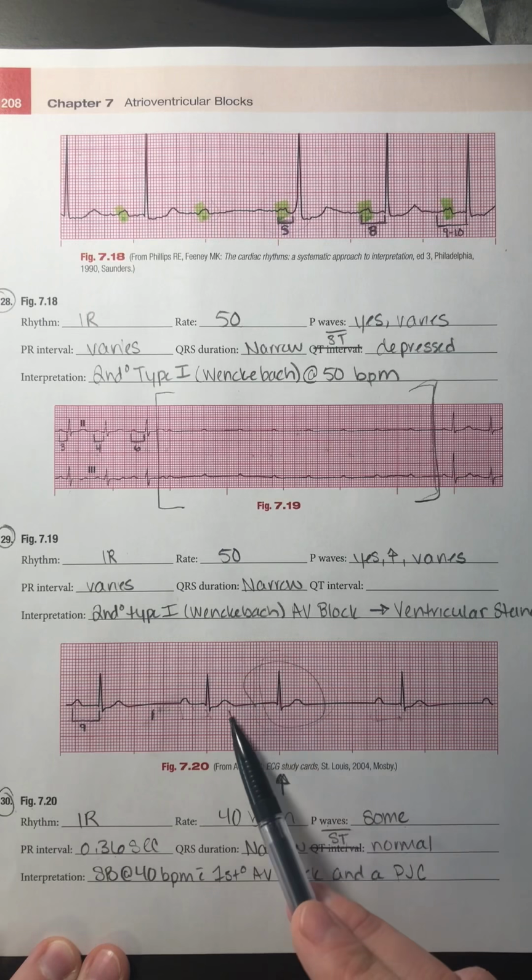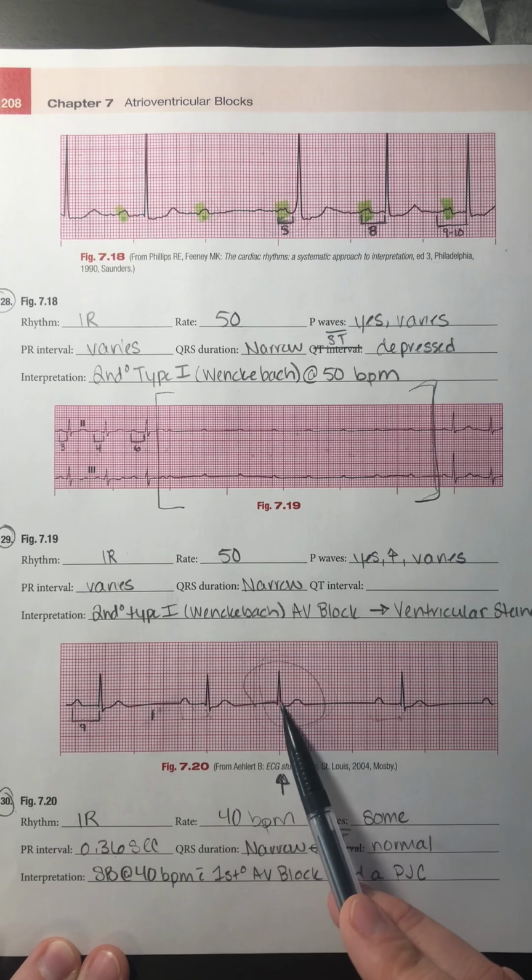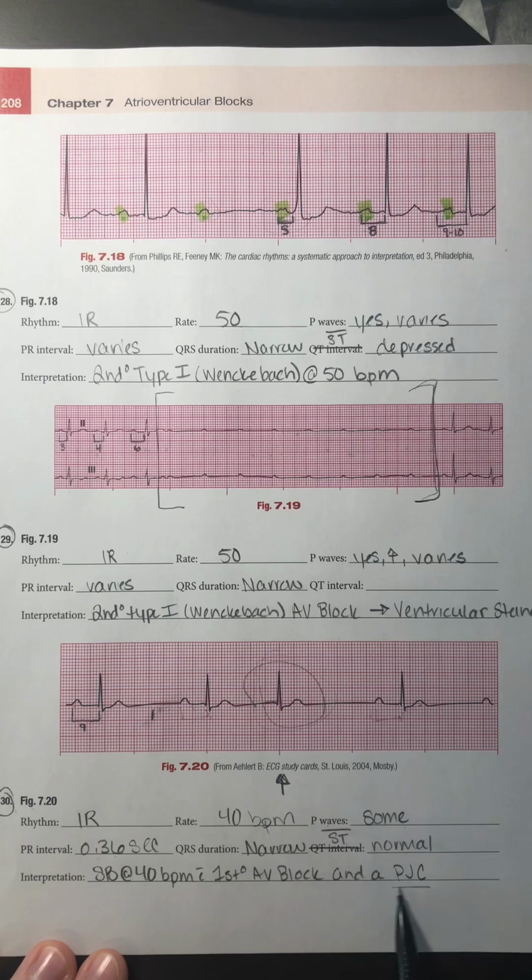And what we have going on here is this beat does seem to come early. It has no P wave, so that's actually a PJC, premature junctional complex. So thinking back to our junctional rhythms, because of that lack of P wave. And what's happening here is probably that this rhythm is so slow that the AV node's thinking, oh my gosh, the SA node's not firing correctly. I need to get a beat off to help keep that pulse up. So it's really the conduction system falling back on that AV node to try to speed up the pulse of this patient.